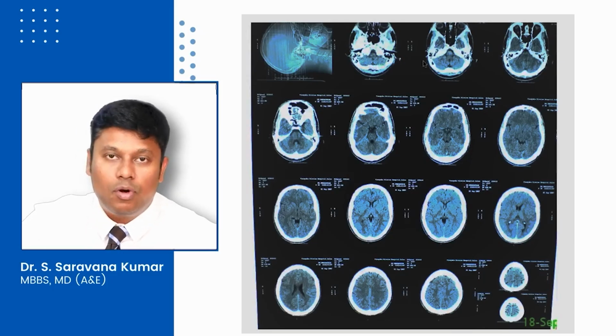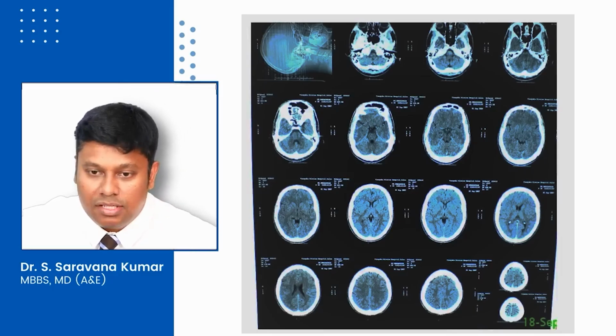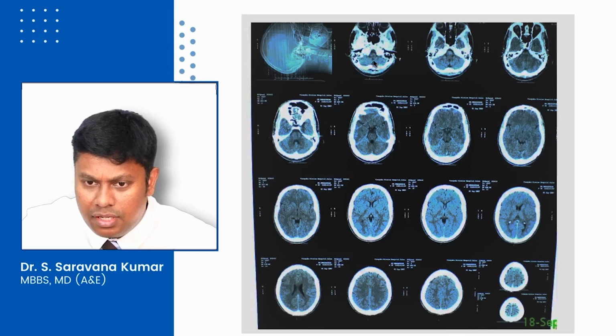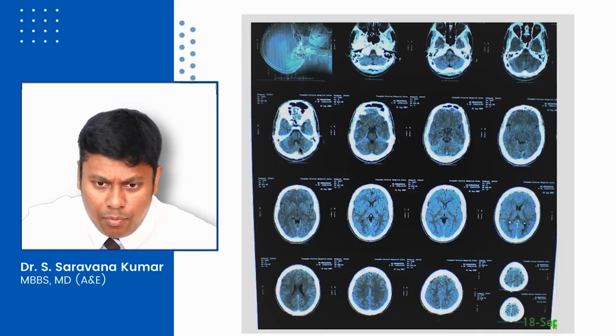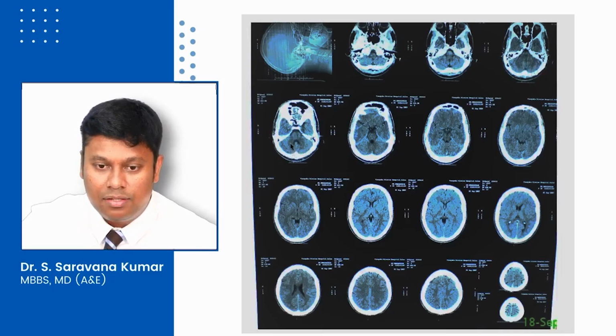How do you identify pons? As I just mentioned, identify the middle cerebellar peduncles or the tooth-shaped structure. Let's quickly scroll through. Do I see a structure like that? Doesn't look like it. Here, doesn't look like it. Here, beginning to look like it. It looks like there are two areas of middle cerebellar peduncles I am seeing here. And when I come to the next slice, it's quite clear. I can clearly see a middle cerebellar peduncle. So that means the image I am seeing here is pons.